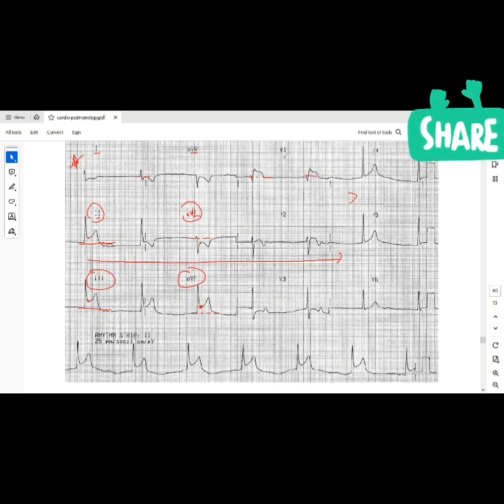Tell me which leads. Remember, for me to say there's an infarction, the leads that have ischemic changes must be looking at the same surface of the heart. You remember which leads look at which surfaces, correct? They have to be looking at the same. Why is that important? Because it tells me that the coronary artery supplying that location is affected. Does that make sense?